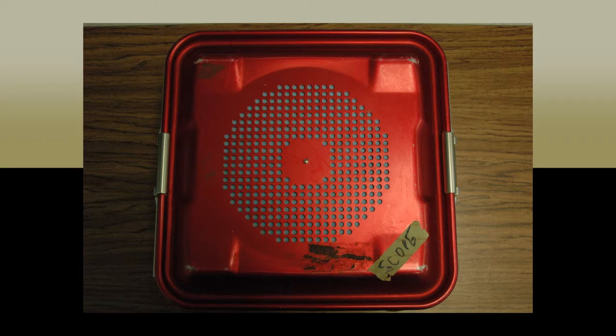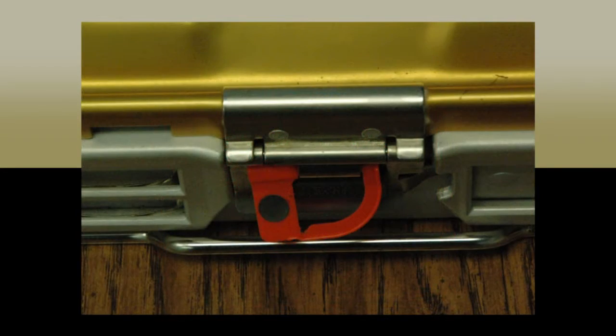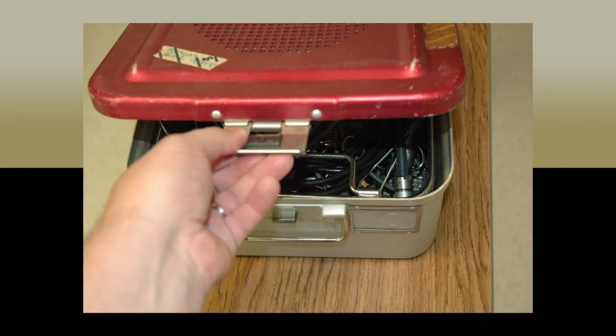There is a special set marked Scope. This is the set that will be used specifically for ankle arthroscopy cases. You will now need to open the appropriate tool case for the procedure and place the instruments on the field. To do this, first, break the seal and remove the lid from the case. Be certain you do not touch anything within the case, as the tray and instruments are sterile. Next, you'll need to glove yourself with sterile gloves.